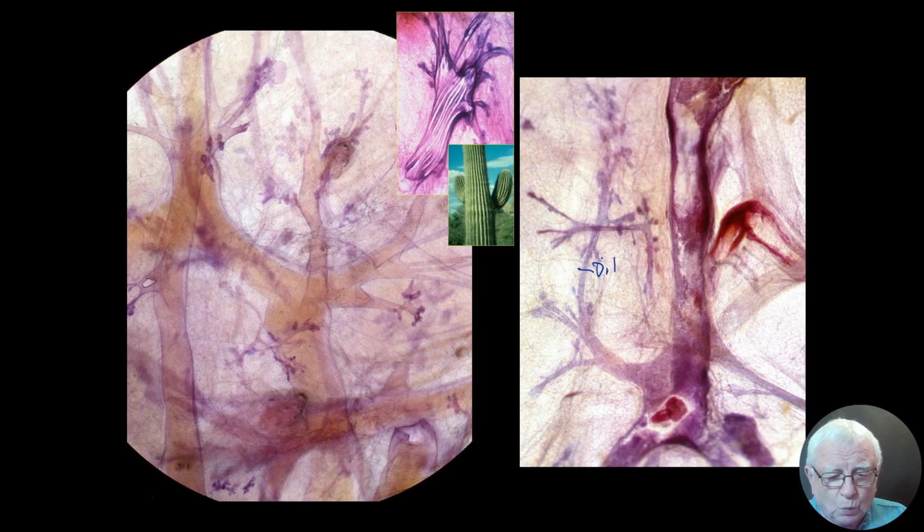This is 0.1 millimeter. This is 10-15 times more distended. Distended by what? The cancer. Here is the carcinoma. So the intraluminal pressure increases, distends the duct-like structure, and if we radiologists are lucky, then we can see these long Y-shaped calcifications. Good luck. We don't see it very often.